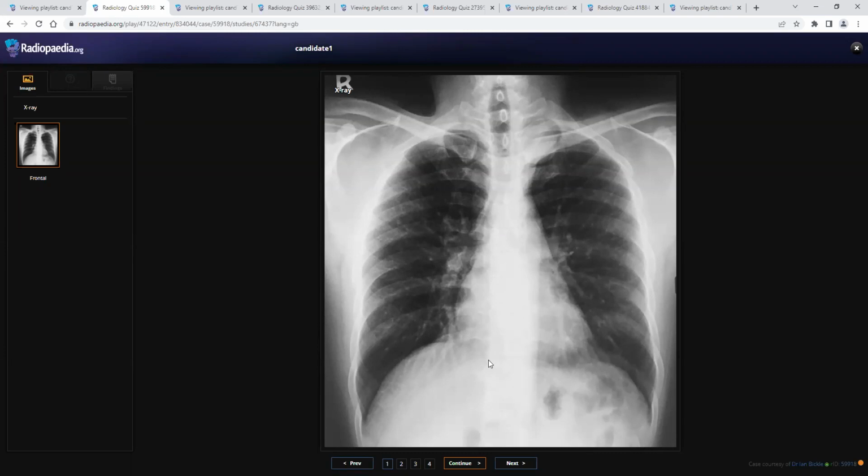In which compartment of the mediastinum do you think this lesion is? I think this lesion appears to be posterior because there is no displacement of the trachea. The medial border of this lesion I couldn't detect sharply; the superior and lateral borders appear sharper than the medial border. So I suggest it is a posterior mediastinal mass. The possibility of a neurogenic mass could be considered, but the soft tissue revealed no neurofibromas in this image.